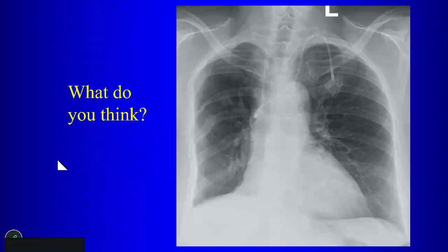All right, so we'll start with this case. What do we got? Why don't you start? There's multiple rib fractures.